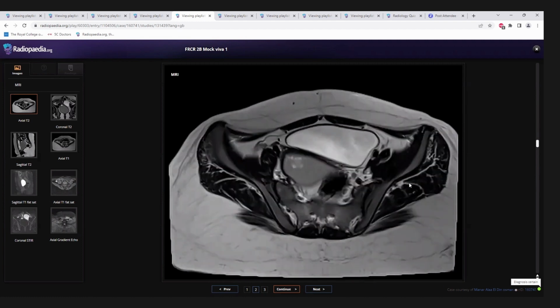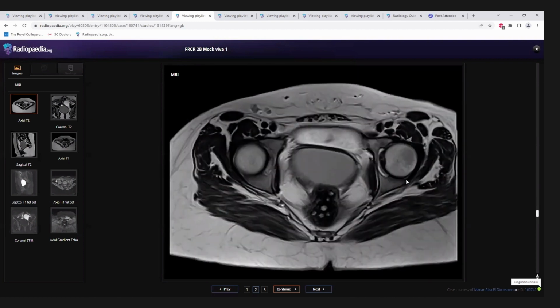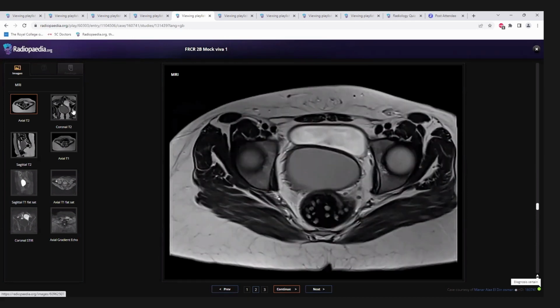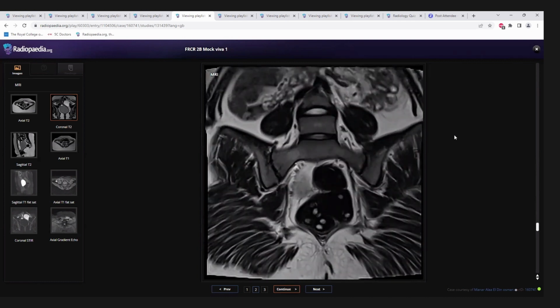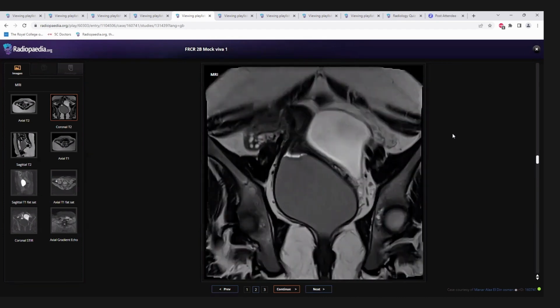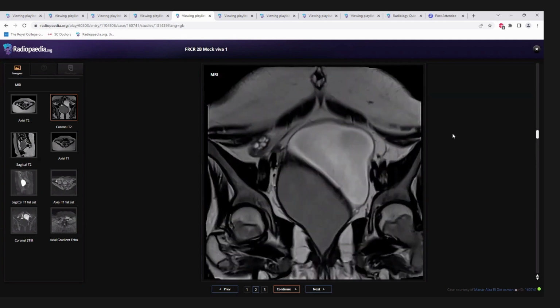I'd like to ask about the clinical data, especially if the patient has periodic pain, and also see the other. Doctor, you have the entire scan. You can go through all the images. Okay, there's other sequences? Yes, please. Just see in different planes. Okay. So this is the coronal image. I'm concerned about any concurrent or other lesion other than this. Okay. So I'll review my diagnosis now.